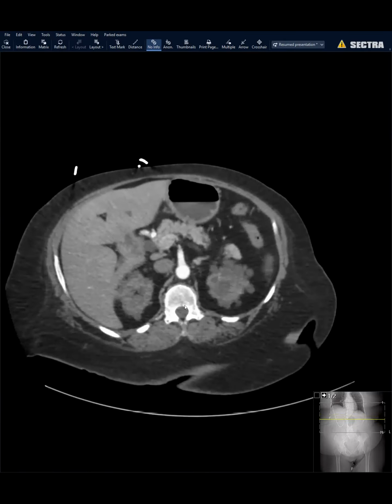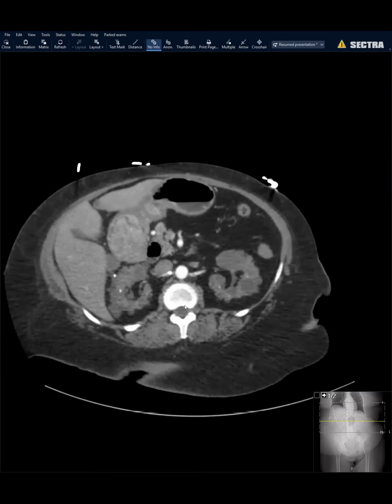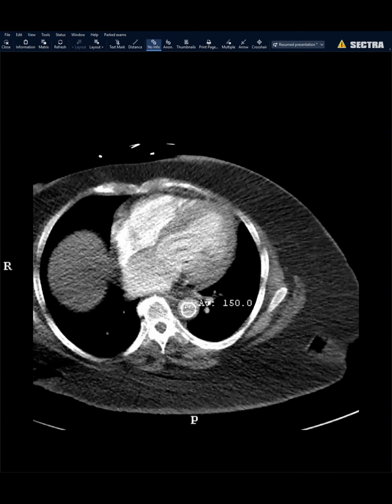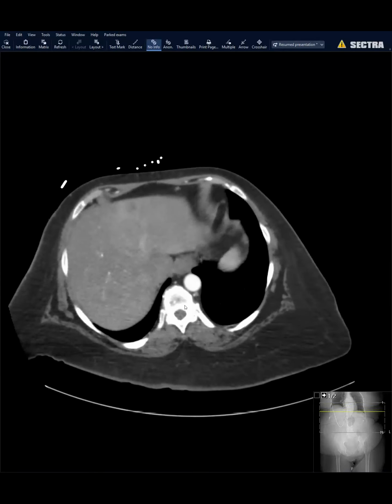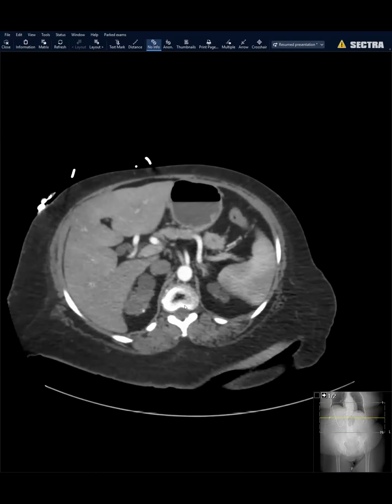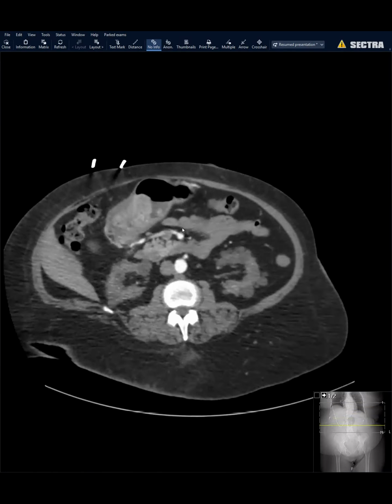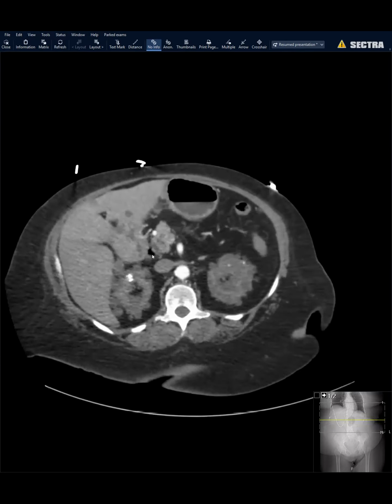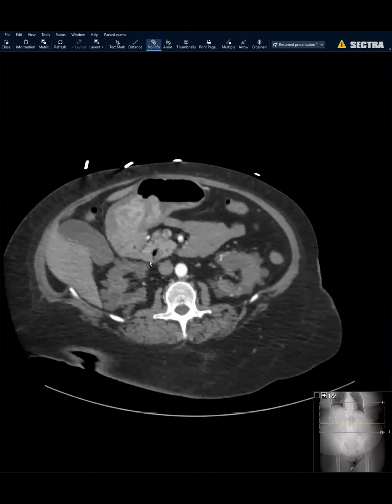That's a great thought in somebody with a transplant. It looks, is it coming from a prepyloric channel? I don't know, there's some kind of polypoid component to it with mass effect. So exactly, I think the morphology is important too. It is definitely polypoid, very large, involving the entire pylorus antrum. It's causing nice mass effect at the ampulla, and that's where that CBD tapered off.